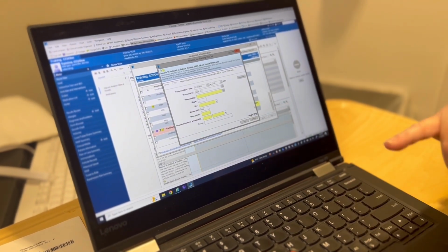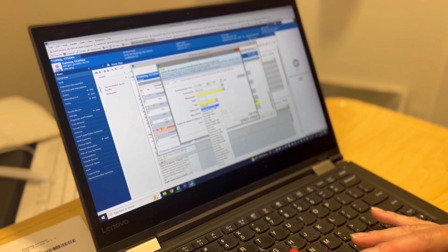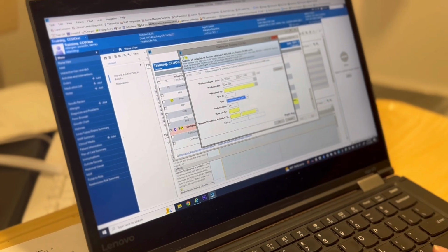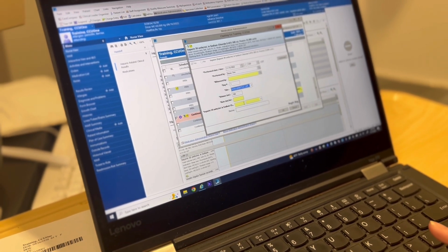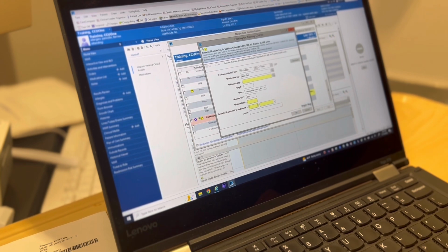So I'm going to fill out everything else before my witness comes in. So my site is going to be, we'll say, see. Notice it has rate, but then down here you have two empty yellow boxes. Remember, we don't do anything by rate with heparin. So I'm going to go here. But notice right now, I can't see any of my numbers.